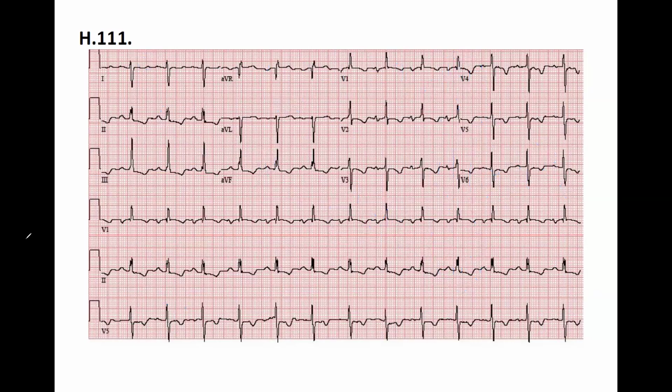I just want to ask, because you said that the RS ratio was less than 1 on the left side. How could you tell? Very simple. Look at the size of the R and look at the size of the S. So it goes more into the negative. Exactly, meaning R over S is less than 1. The absolute value is not the relative value, it's the absolute value.